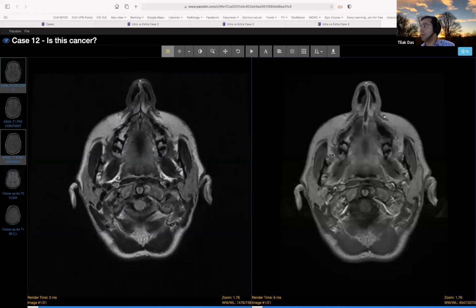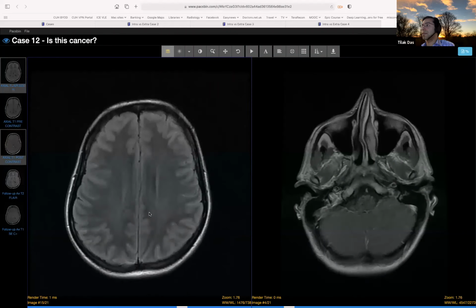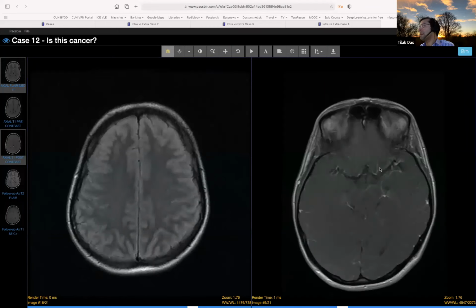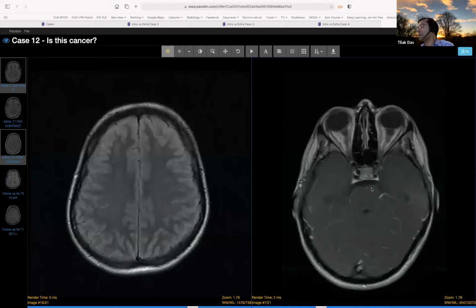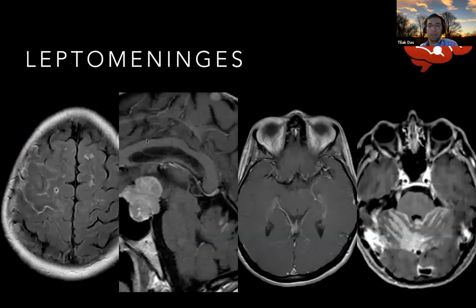And then finally, this was a tricky one. This patient has what looks like some hyperintensity in her sulci on FLAIR. It looks a bit swollen. And this is when leptomeningeal disease becomes difficult, because are you just seeing normal vasculature or is it leptomeningeal? And the areas that I find useful then are to look at smaller areas such as the occipital lobe or maybe the vermis of the cerebellum again to try and work that out rather than up in the cerebral cortex. And this was meningeal disease, but this was a meningitis related to Behçet's disease rather than cancer. Okay, great. Thank you.